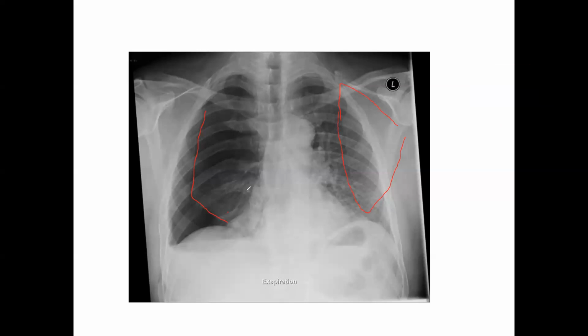We can also see the reason for this pneumothorax as well. You've got rib breaks right here. So you see a break there, break there, break there, maybe a break there. Now, if you remember flail chest, where you get the paradoxical movement of the chest and so forth, because if you remember, I'll turn the camera back on.